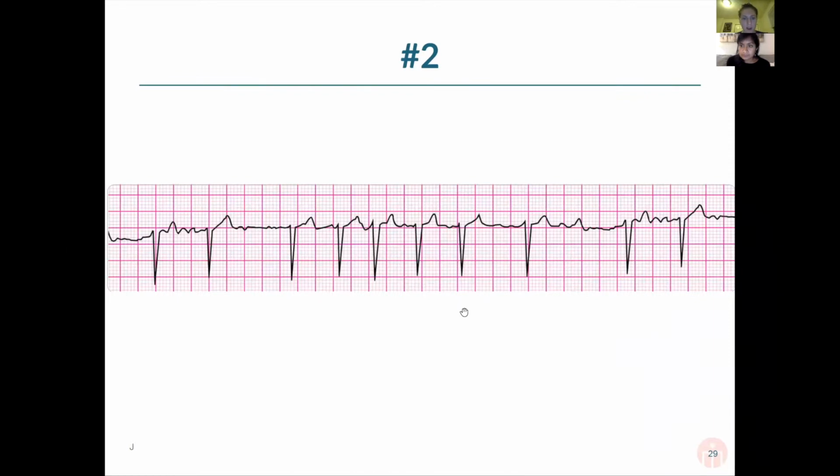And really, this is a classic AFib. It's irregularly irregular. You're seeing some artifacts when you see these little blips, but there really aren't any classic P waves before the QRSs. You see that the RR intervals are abnormally spaced. They're changing a lot. This is a very classic AFib rhythm strip, which you should be aware of for the purposes of the Step. Absolutely.